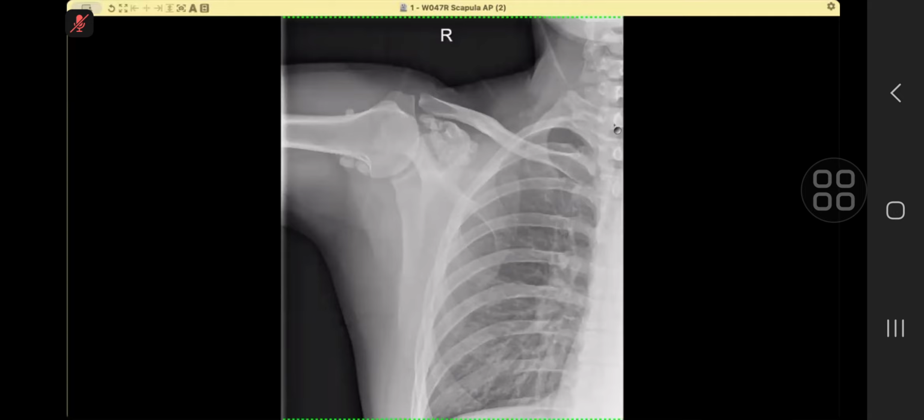Okay, what will you like to do next? I will inquire about the history of any shoulder joint pain, and also I will suggest a referral to the rheumatologist. And also I will suggest MRI to see any other synovial abnormality. Over to you. You can ask for MRI. Sir, I have requested. Accepted.